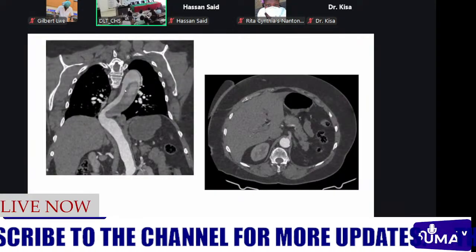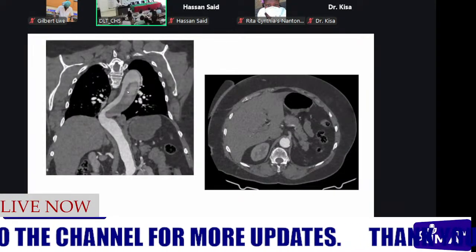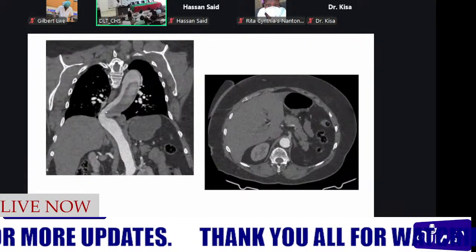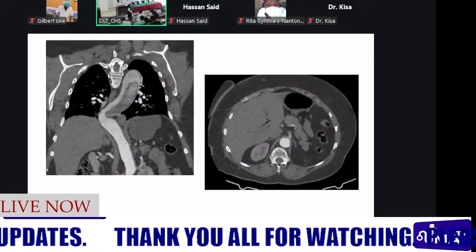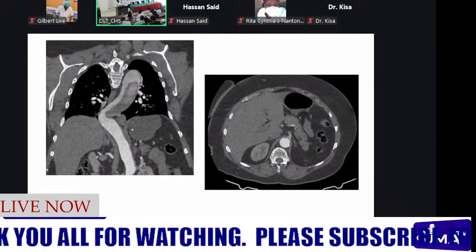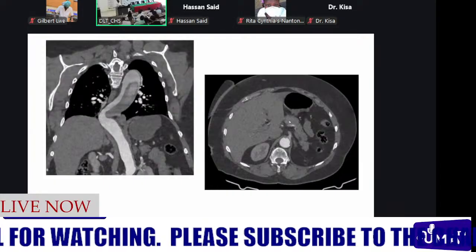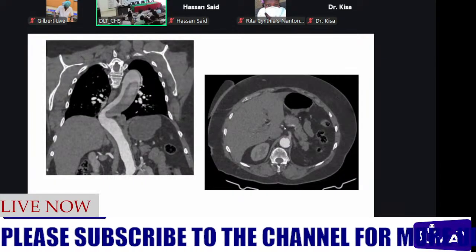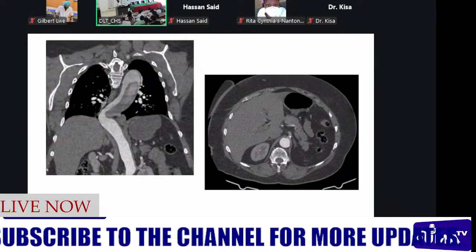Still, there is evidence of ectasia here. And it had this tortuous course. We see it crossing over from the left to the right, then back to the left side in the abdomen. So the dissection actually proceeded to involve the abdominal aorta. And in this axial slice, we are in the abdomen now, and we are at the level of the celiac trunk.